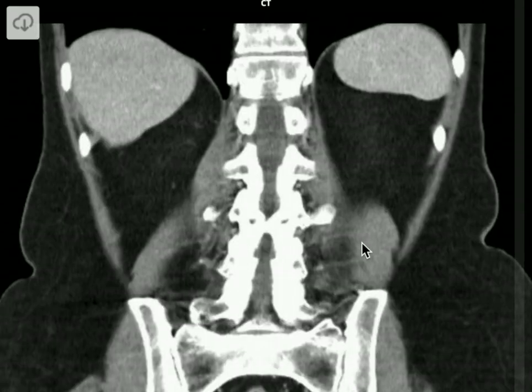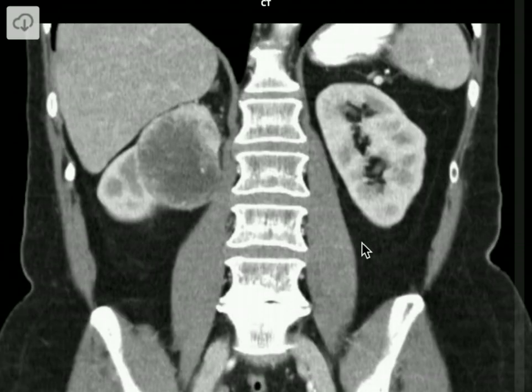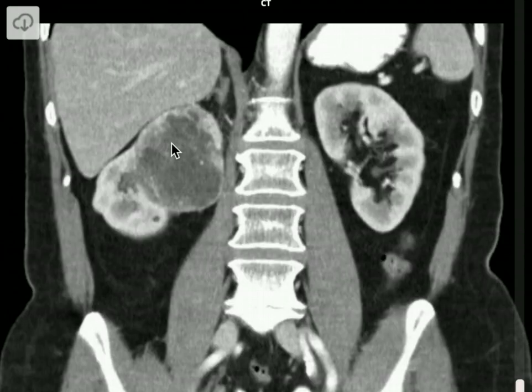Okay, so the major abnormality here is this mass growing out of the right kidney. It doesn't look like a simple renal cyst because it's large, it's quite heterogeneous, and also it's enhancing. Simple cysts don't enhance as they don't have a blood supply, a little bit like this little circle here. There are lots of differentials for renal masses, but unfortunately I won't have time to go through this today, so I'll put a link to a useful website at the end for if you're interested. However, I can tell you this is suspicious for renal cell carcinoma.